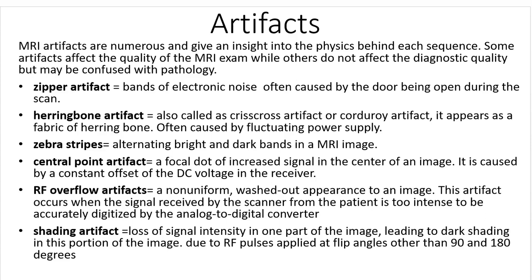And these are the MRI artifacts. MRI artifacts are numerous and give an insight into the physics behind each sequence. Some artifacts affect the quality of the MRI exam, while others do not affect the diagnostic quality but may be confused with pathology. The zipper artifact. These are bands of electronic noise often caused by the door being opened during the scan.